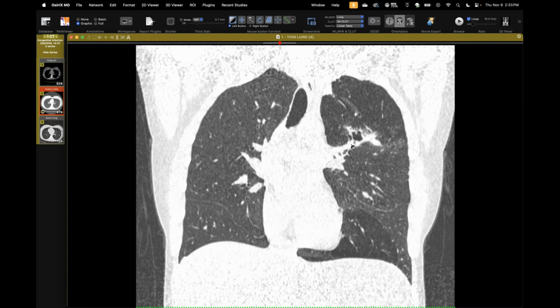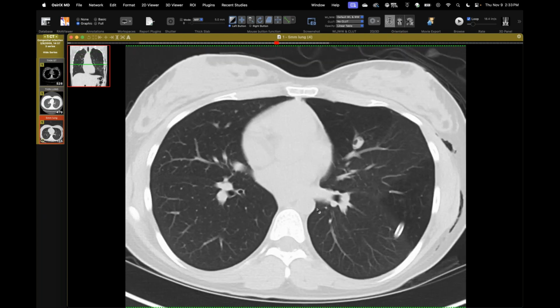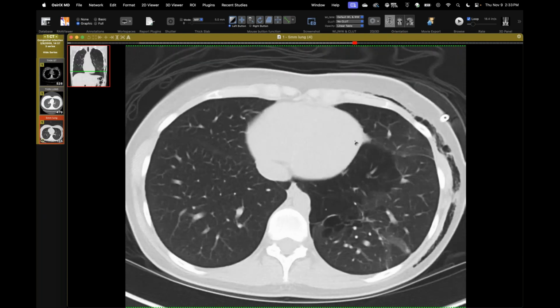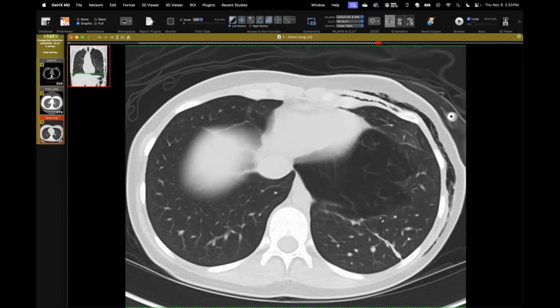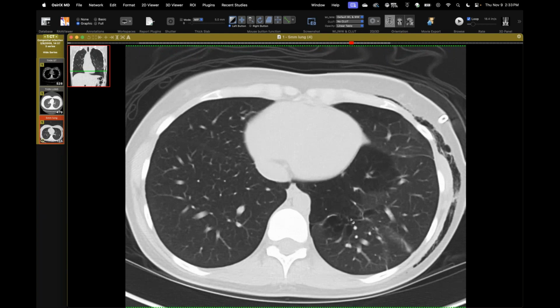Okay. Because I always think of it just as a benign process that's been there their whole life. It hasn't caused problems. But in this particular case, resection is not really an option because it's so multifocal. It's an interesting bronchial atresia because it's involving the left upper lobe, but then it's involving another segment down here, and then you've got another area down here in the left lower lobe, and I'm convinced this is a CPAM. So, just an interesting one.